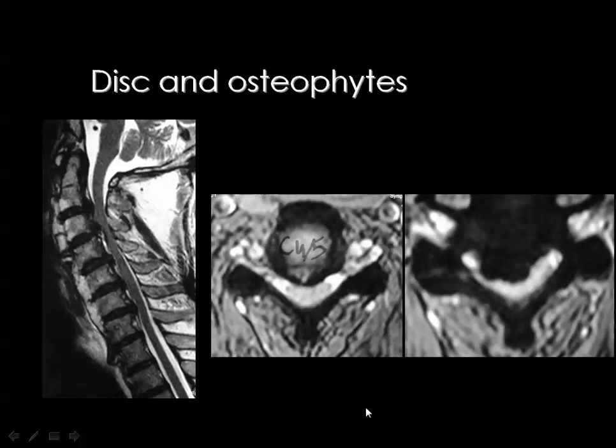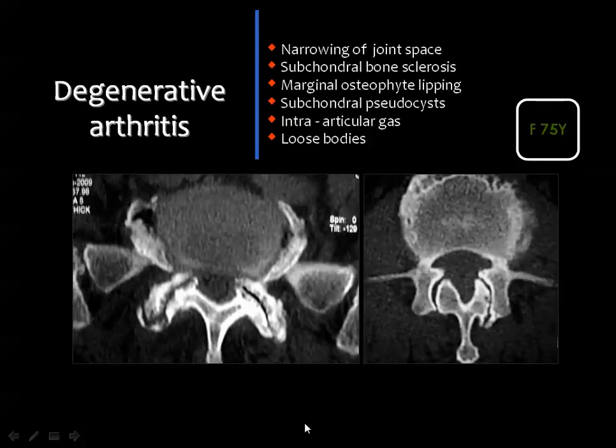Actually, this terminology is no longer used, but we can safely say that this disc is associated with osteophyte, or associated with traction osteophyte, and we should include this in the report for the surgeon to be ready to remove the disc as well as the osteophyte. Then we have anterior osteophytes, which are of little significance, and posterior osteophytes, which are more important.